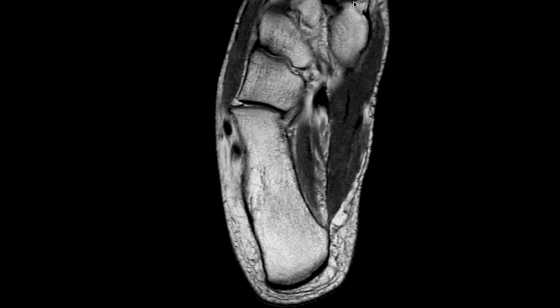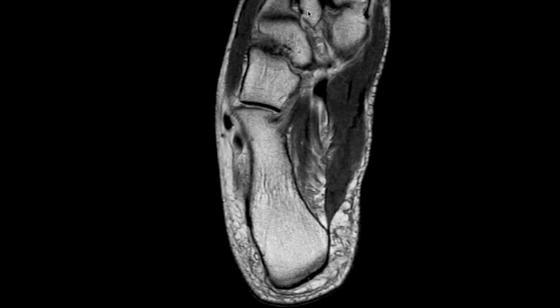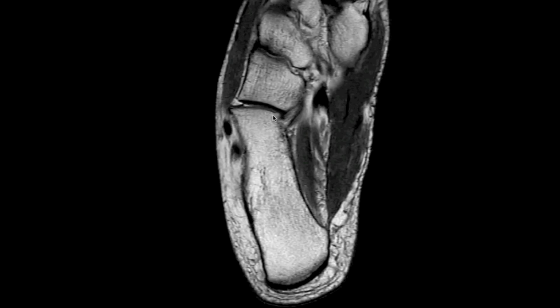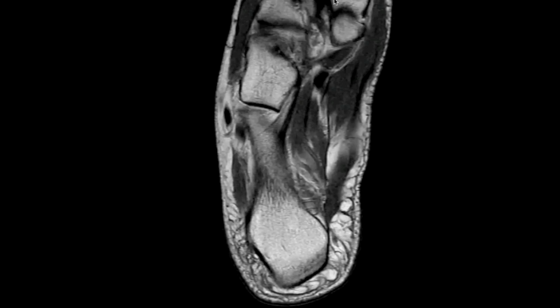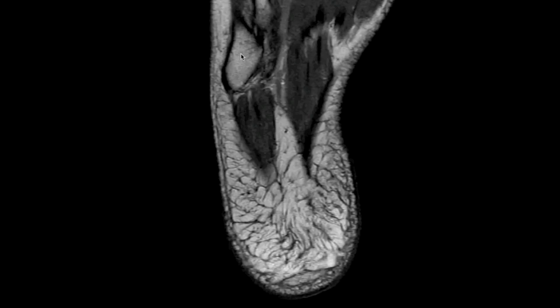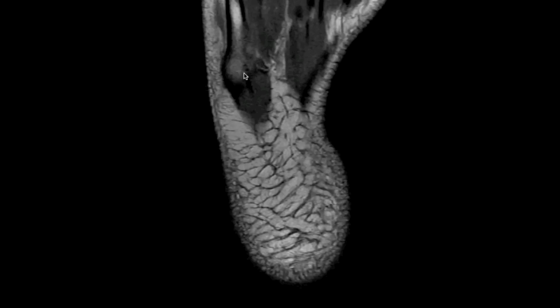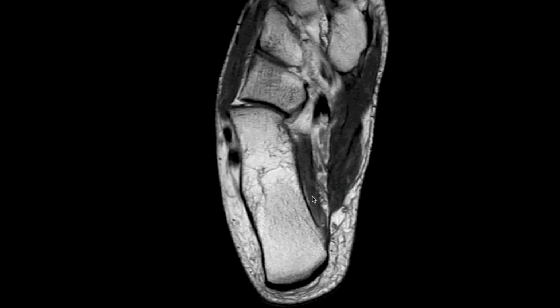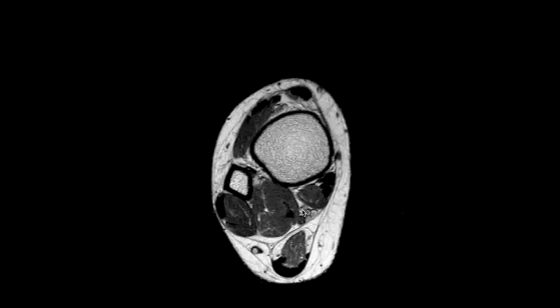A lot of the structures that we'll be following through the ankle will insert into the bases of the metatarsals, so we have to evaluate them carefully. Within our field of view, we'll see the first, second, third, fourth, and fifth metatarsal bases. The fifth metatarsal will have this bony protuberance called the tuberosity, and at the tuberosity, the peroneus brevis, lateral cord of the plantar fascia, and peroneus tertius may attach.